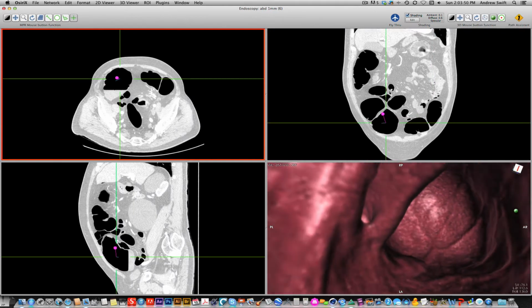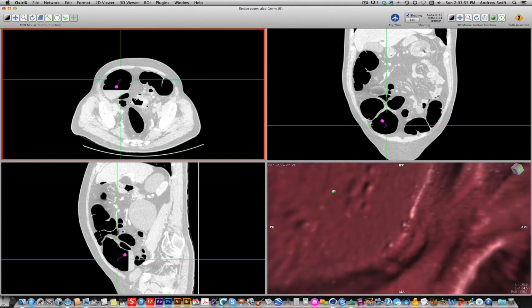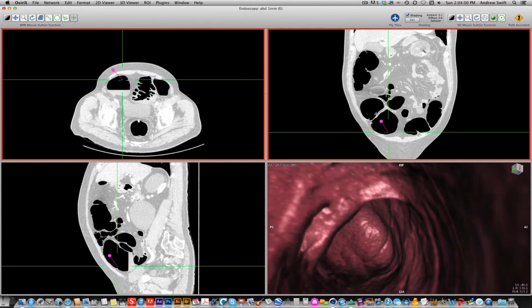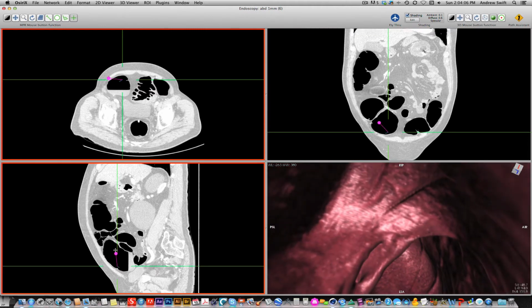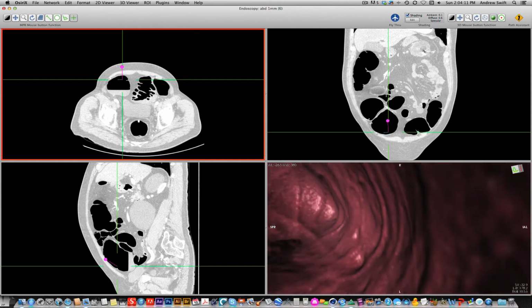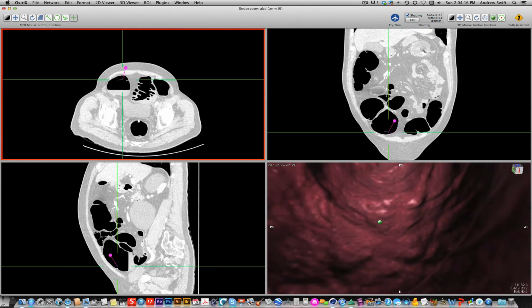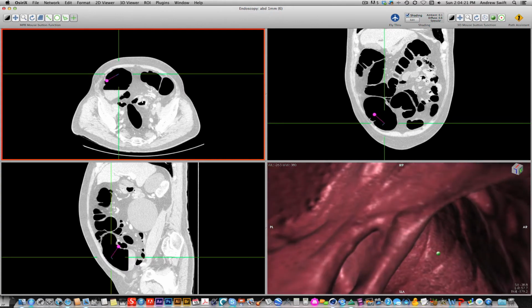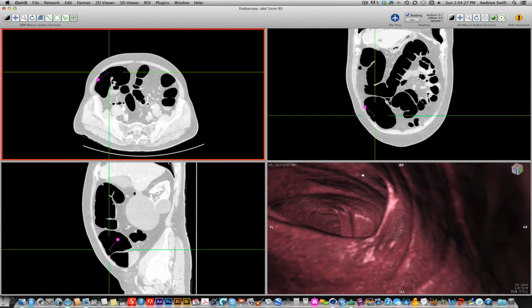Let's see here. You can also kind of create the same endoscopy type of view, I think, without, hang on a second, let me organize this. Let's see here. I think I'm actually upside down, but oh, there we go. That's the direction we want to go. Yeah. And so I'm just clicking and panning and going forward. There we go. Right?